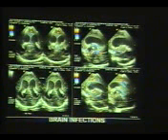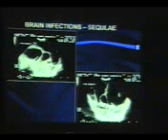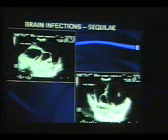Then there is high flow, due to increased flow, hyperemia, and then we can also see the hydrocephalus. So all this we can immediately recognize as the sequelae of meningitis, which is taking place due to this infection. Then again, with a long-standing infection, long-standing outflow tract obstruction results in gross hydrocephalus. You can see here these strands floating in the ventricles, a highly echogenic wall, and this is the gross hydrocephalus you can see here.